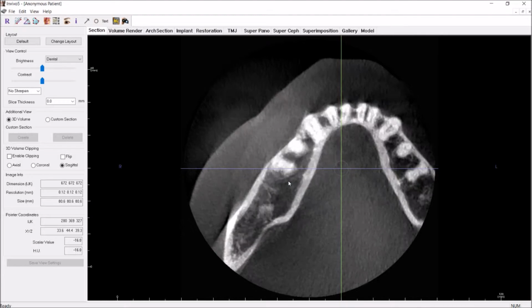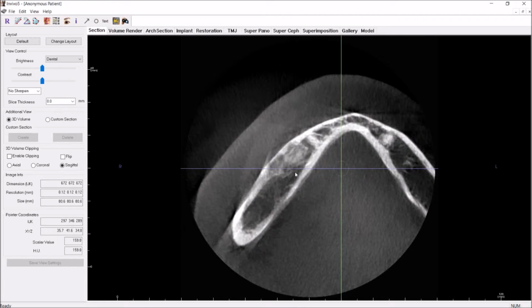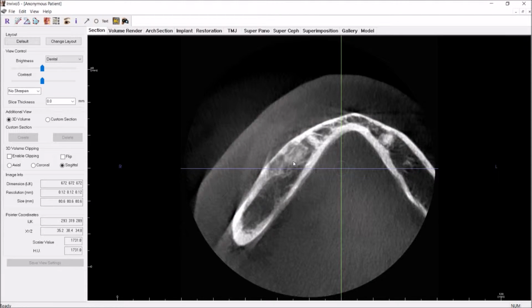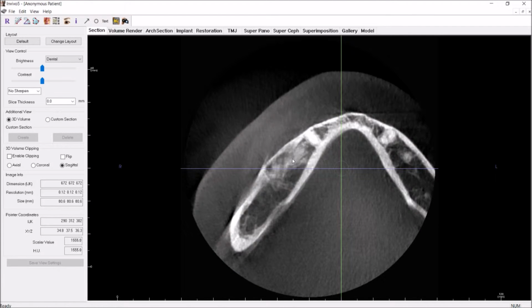And internally, you have to decide, is it radiolucent, or in the case of cone beam CT, we call it hypodense, or is it hyperdense, or is it mixed? And to me, that looks very mixed. You compare it to the trabecular bone around it, and it looks more hyperdense, but it's not a uniform hypodensity. It's not homogeneous, more of a heterogeneous.